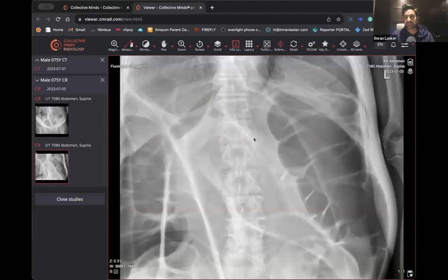So we've got a few answers coming in, and at first it can be quite difficult to tell, because we don't have the entire abdomen on this particular plain X-ray. So you have to try and figure out what is actually happening from basics. First off, we're looking at an abdominal film, and we can see there are multiple loops of dilated bowel. Is this large bowel or small bowel? These look like haustra, can you see these? But they don't go all the way across, so this wouldn't be in keeping with small bowel. It is more likely to be in keeping with large bowel.